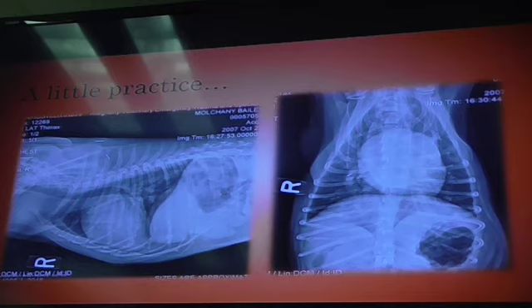Okay, and then we go to the aorta, right? Y'all got that? Okay, so if I'm exiting the right side of the heart through arteries, the main pulmonary artery, and I have disease there, I would expect the arterial side to be enlarged.